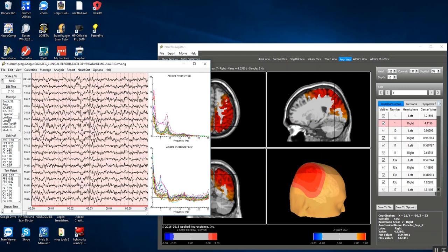This is a patient that had been assaulted with a bat to his right parietal region. This is a patient that I personally dealt with when I was at the Bay Pines VA Medical Center. He's considered a traumatically brain injured patient that was also in litigation. In any case, he was paralyzed on the left, had spatial neglect, could not write on the left side of a piece of paper. He was a very intelligent individual with no left hemisphere damage, but the CT scan was clearly evident of a right parietal damage. And you can see slow waves in the right parietal region here.